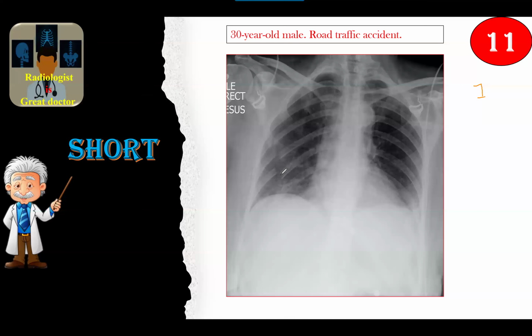And the ribs here are fractured on only one side, but we have at least 4 ribs, maybe 5, by the way. And we have definite blunting of the left angle. I'm not sure about pneumomediastinum, but no problem. In the exam, if you suspect it, look for linear streaks surrounding the aortic arch. Good. This is a description regarding the positive.